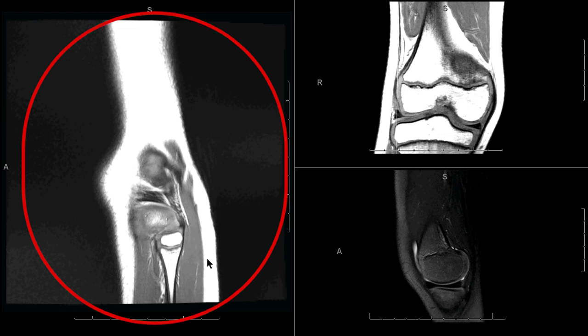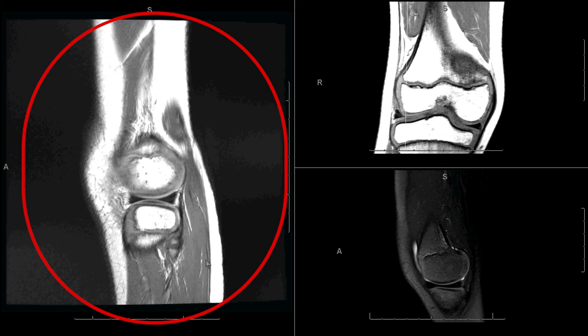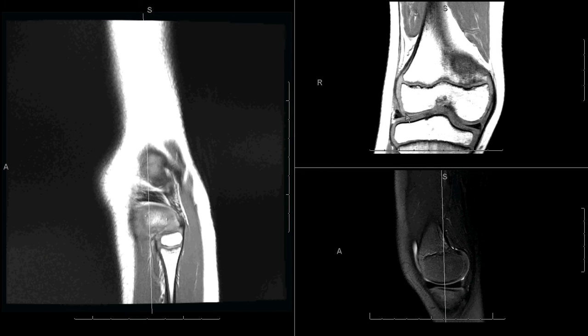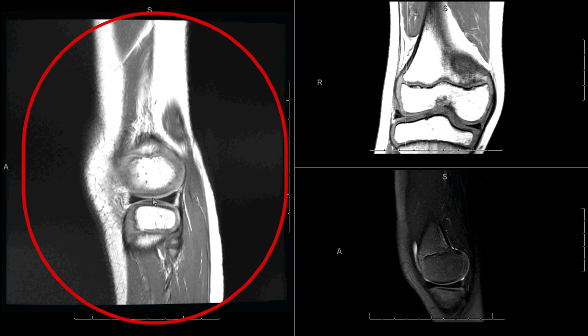So just as we are told in adult MRI, looking at the lateral meniscus, one should expect a bow tie configuration, and you should see the body of the lateral meniscus on no more than three 3 millimeter slices without an interslice gap. So we see here we're far out lateral, corresponding coronal here, and there's 1, 2, 3, and we're already losing the body of the lateral meniscus. And so this is not a discoid meniscus.